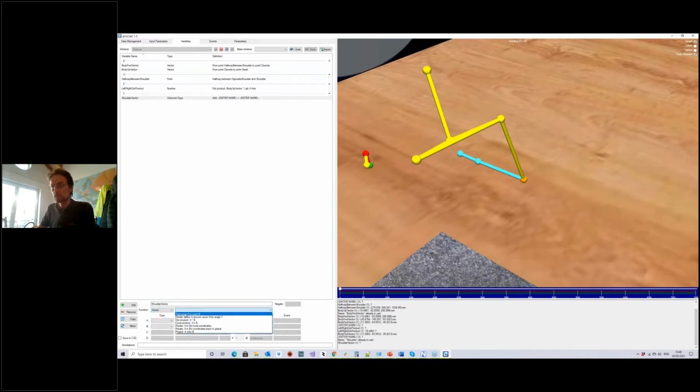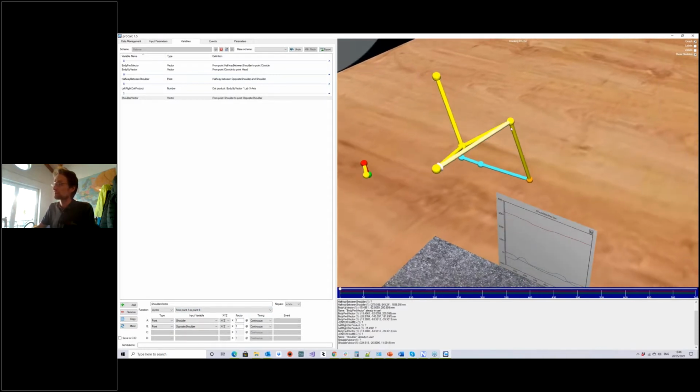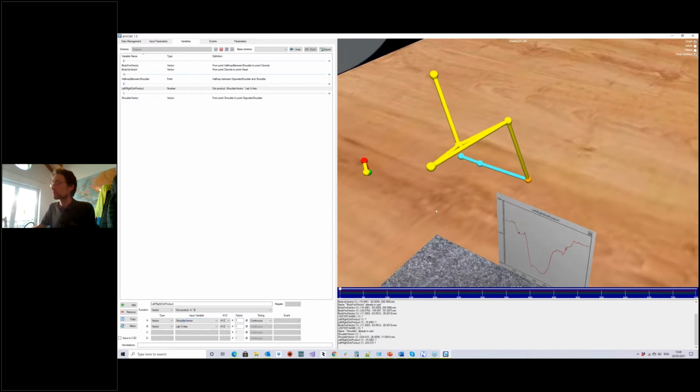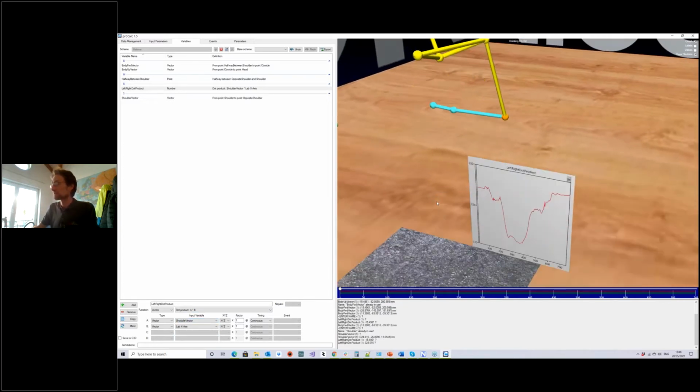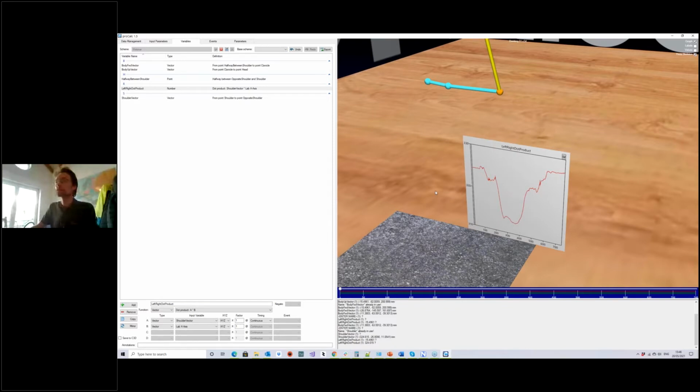There we go. From A to B again. That's usually how we create vectors. So now I have the shoulder to opposite shoulder vector, and this is actually the one I want to use as input for my dot product. And the cool thing is, if the shoulder to opposite shoulder vector is aligned in the same direction, I get a positive value here.